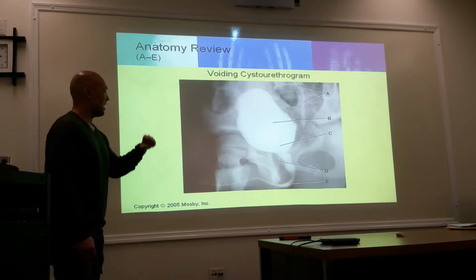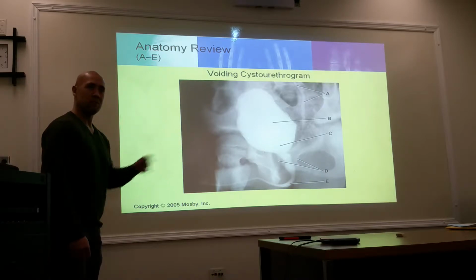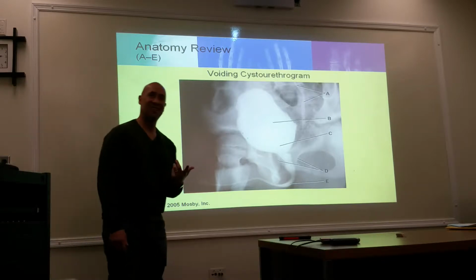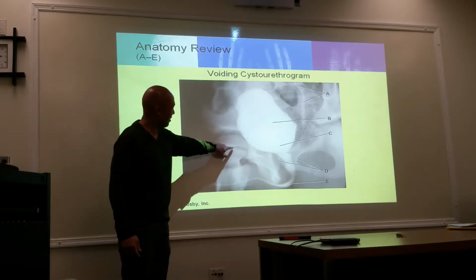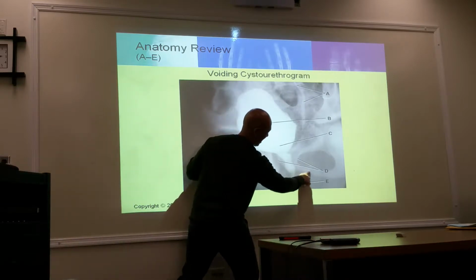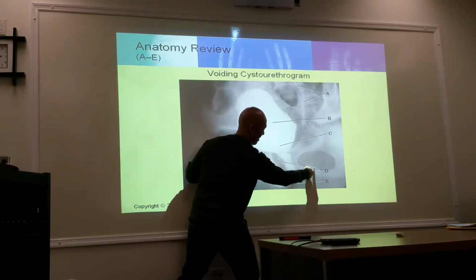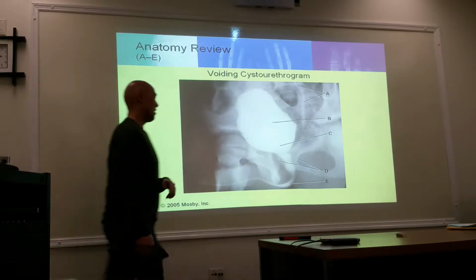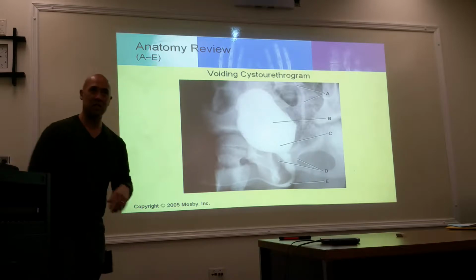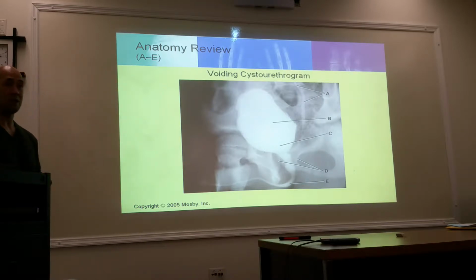Can we also determine the age of this male? It's a kid. How do we know? The growth plates are right there. Ah, so you guys know your stuff now. Look at this. So growth plate there. Look what's happening here. That hasn't even formed yet. See that? The obturator foramen. So you've got that area between the ischium and the pubis. They haven't even formed yet. Ischium and ilium, I should say. Sorry. All right.